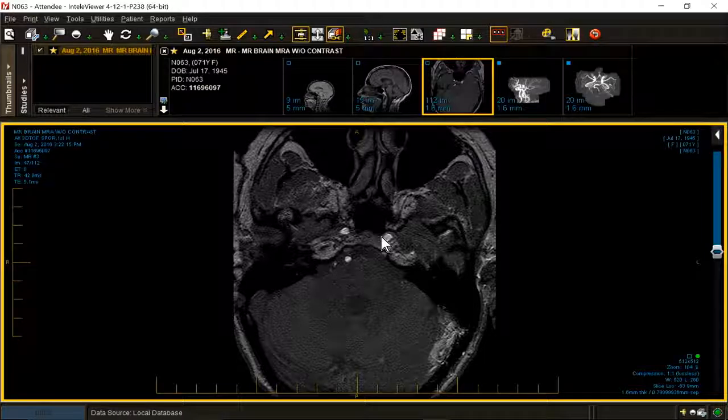I'll give you about 15, 20 seconds to assimilate and digest. Okay. You've had an opportunity to come up with your own diagnosis.